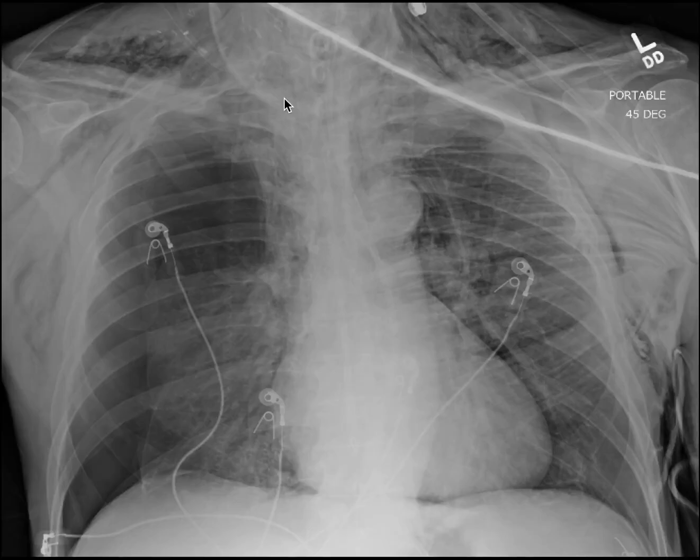But then when the patient exhales, it closes. And that's a ball valve effect. And slowly over time, air will accumulate, and over hours, this will lead to this. And that's exactly what it sounds like happened in this scenario.